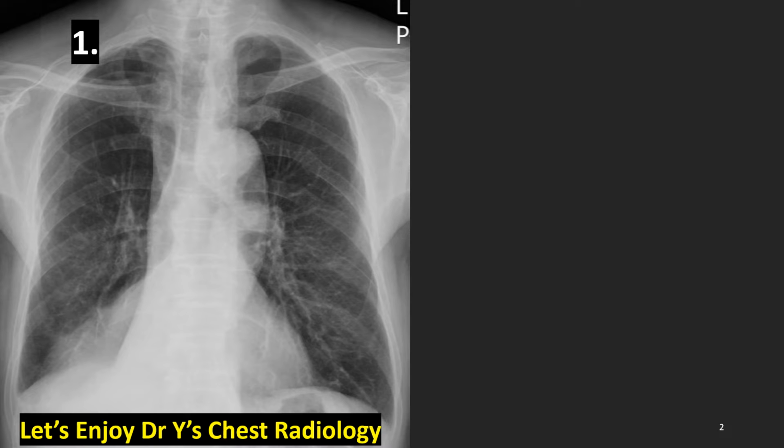What do we see? Yes, we see 2 oblique lines in the right lower medial portion. One is dense and the other is denser. And also we see a darker right upper lung zone than the left lung and not clear visualization of the right hilum, and even an obscured right diaphragm medial portion, right?